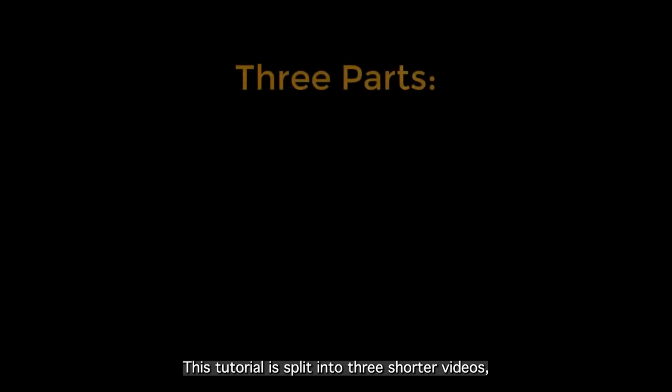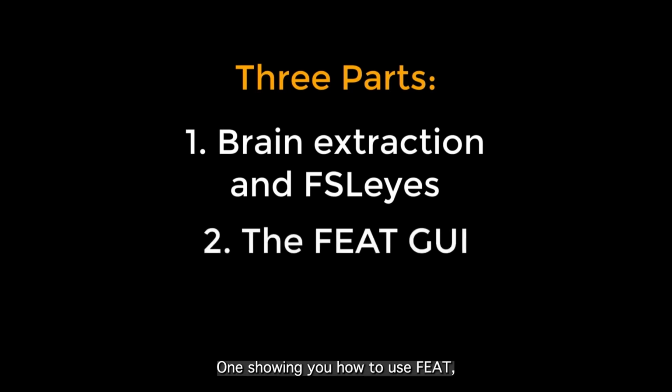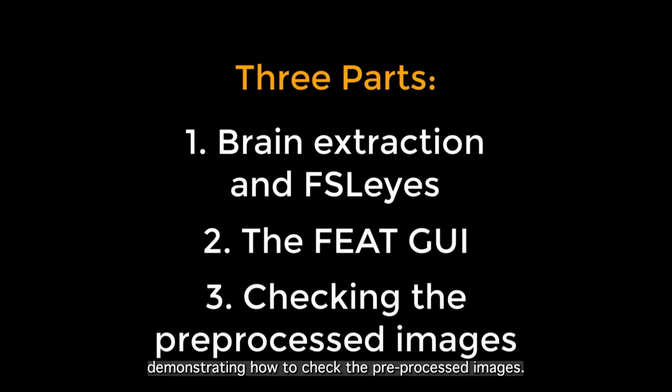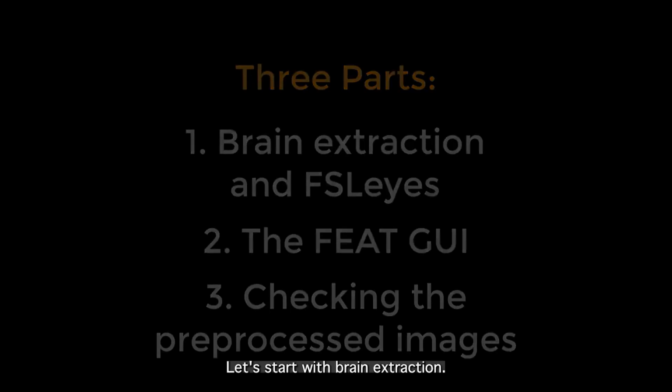This tutorial is split into 3 shorter videos, one covering brain extraction and a brief introduction to the FSL data viewer, one showing you how to use FEAT, which does most of the pre-processing steps, and a final video demonstrating how to check the pre-processed images. Let's start with brain extraction.